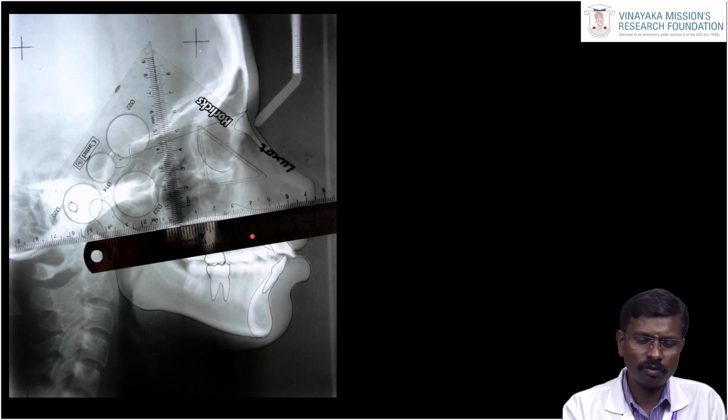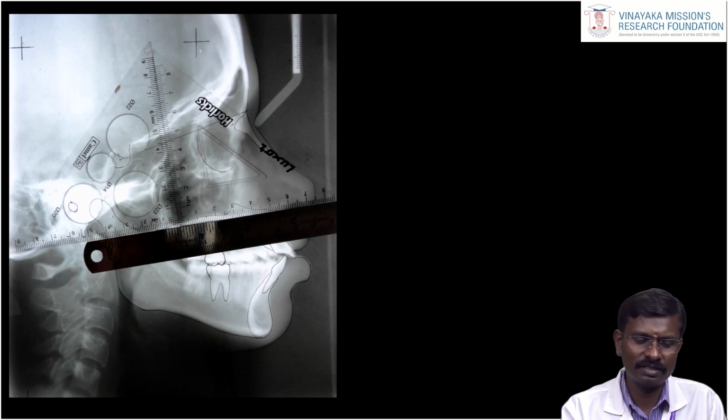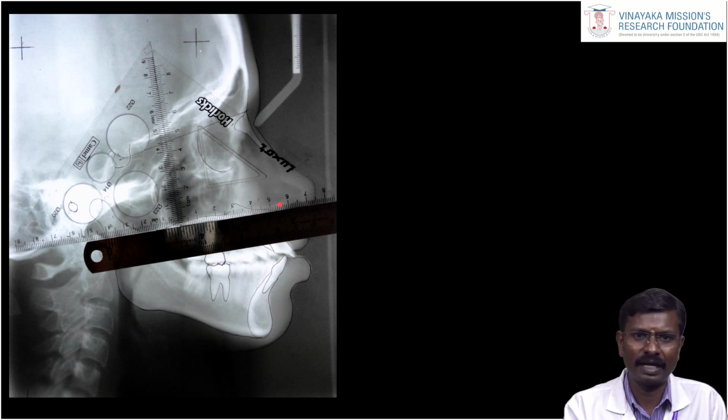Going back to our school days, if you want to transfer one line exactly to another line and find out how much of an angle is there between the two lines, this is the way we used to transfer. We put one base scale on the base line and two set squares, one on the left side and one on the right side.